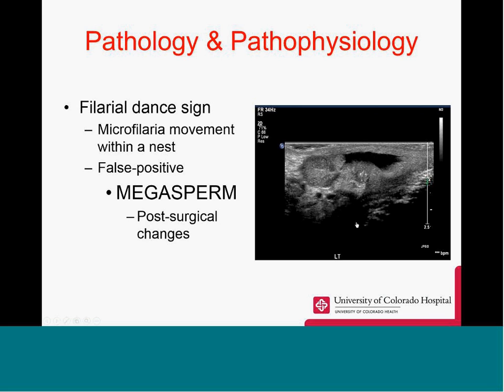These are a post-surgical change in vasectomy patients. Because the sperm can't get out, they become abnormal. The sperm get their heads enlarged and they become sticky and glom together to make this megasperm. They are swimming around in there, so that's how you get the false positive for the filarial dance sign. Obviously, you'll use your clinical findings to help decide.